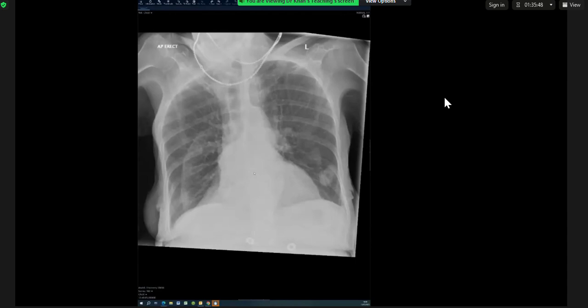So once you've picked a central increased density, the first thought is, is it just a hiatal hernia? Yeah, but you can see that the density is higher here than it is here. So there's something going on here. So once you've picked that, you need to think if it's a tumor or something in the middle, it would be causing something. So I'm going to look here, there, all sides, and then you would see this triangle. Yeah, it's a typical appearance of a central mass causing a peripheral collapse. If I didn't have this, it would be a better X-ray.